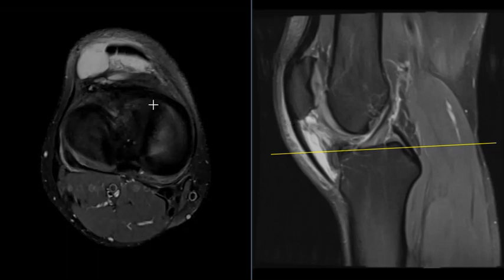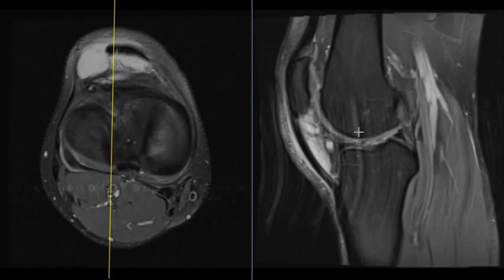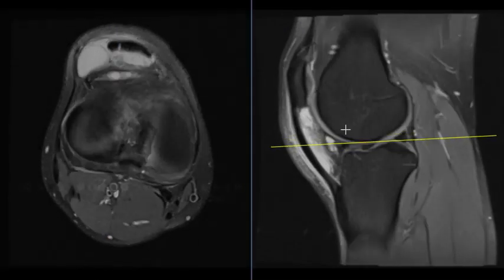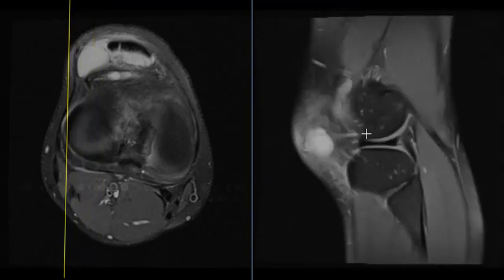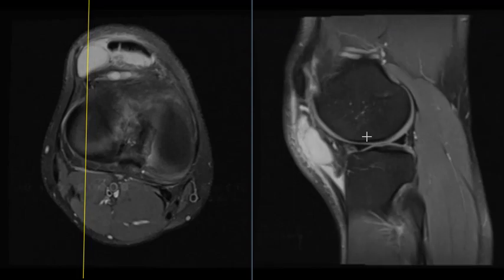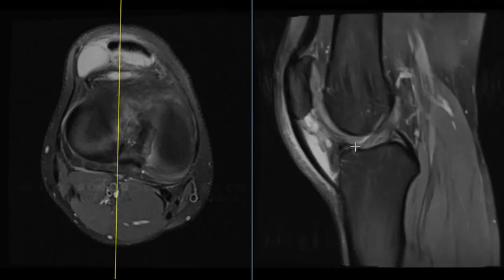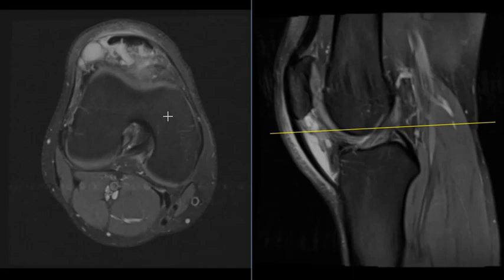It is a complex cystic lesion, and the two things we think of when we see a cystic lesion like this are, number one, a ganglion cyst, and number two, a synovial cyst. Sometimes in younger patients, if we have a complex cyst, you can have a neoplasm that can look or mimic a cyst, but this patient has had this for 7 years, so this is probably just a benign cyst, like a ganglion cyst or a synovial cyst.